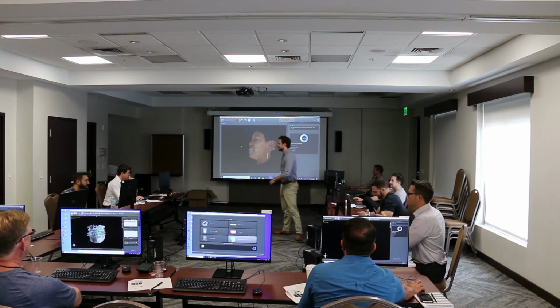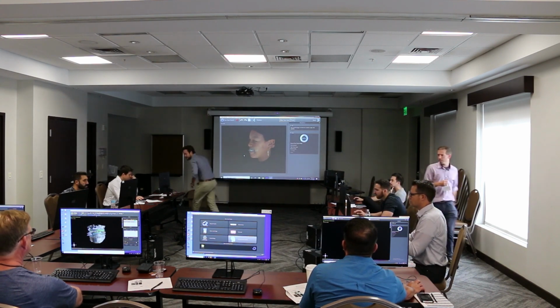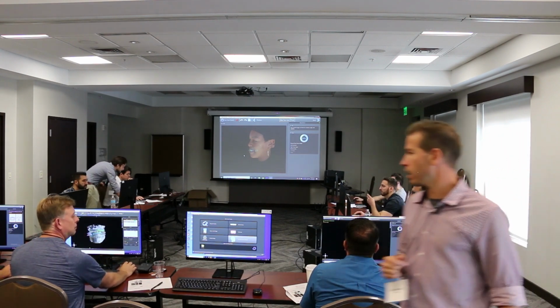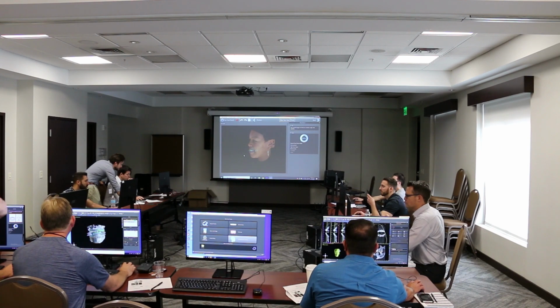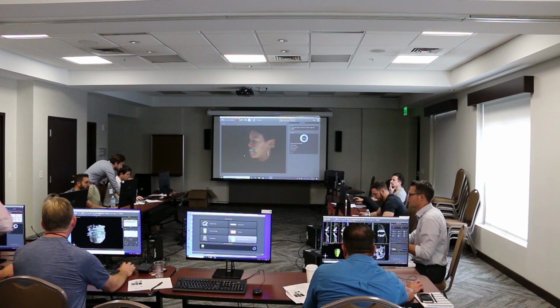All right, so let's get to this point here. So who's got the files up and playing with them? How do you click on the nose on the STL? So no nose on the STL. Click on the STL, each canine, and then just the nose on the OBJ. Okay, and that's it. And then you go to next.